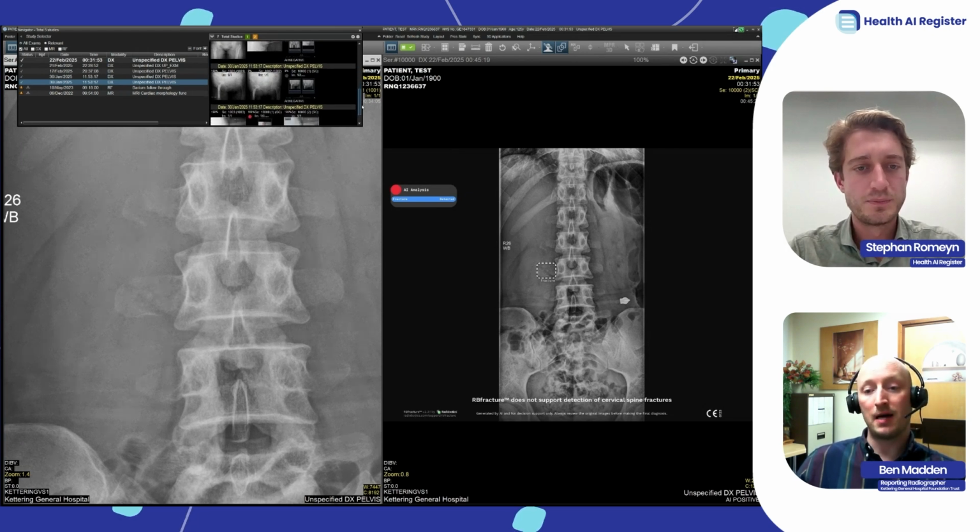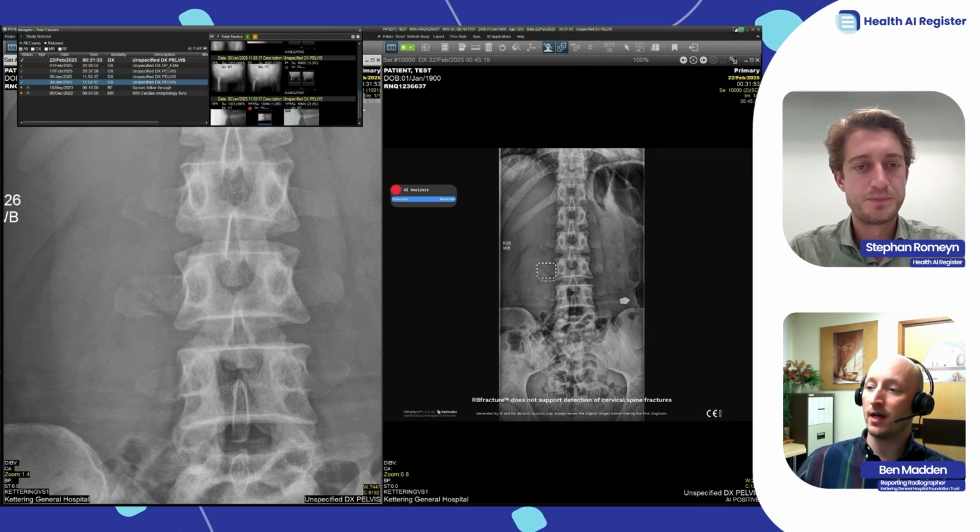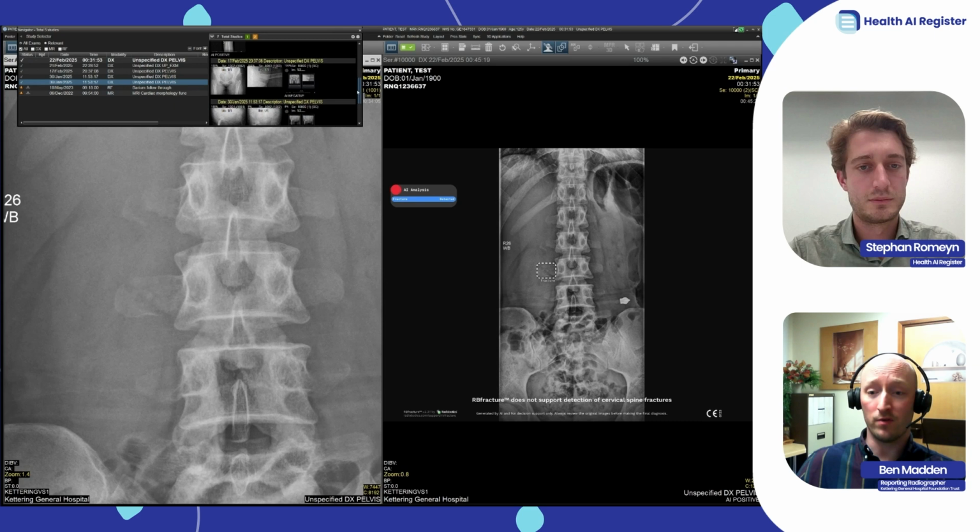Yeah, I mean, it depends how you report, but me personally, I would like to look at the x-rays first, have a good look over them, and then as some sort of comfort blanket, look at RB's analysis, and see whether I need to look further or I can move on as I thought.